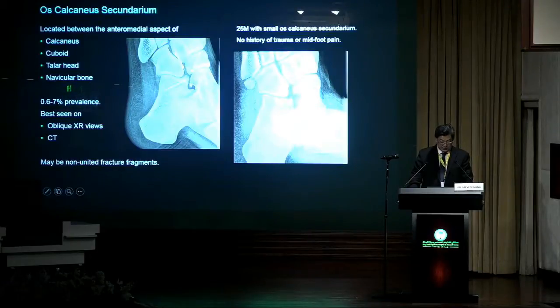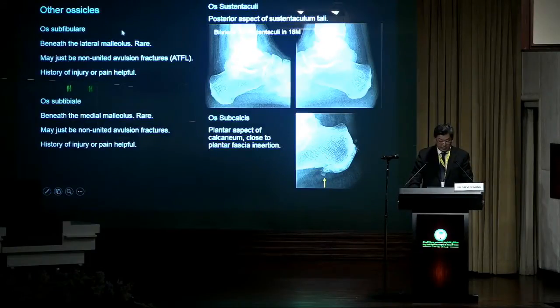And people say that it may be fractured from the anterior calcaneum or the adjacent cuboid bone. So here, this is one case. That was just an incidental finding. I was actually reporting on this fracture here when I noticed that there was a small little os calcaneus secundarium there. But in this patient, there was no midfoot pain. The pain was soft tissue swelling related to that injury.